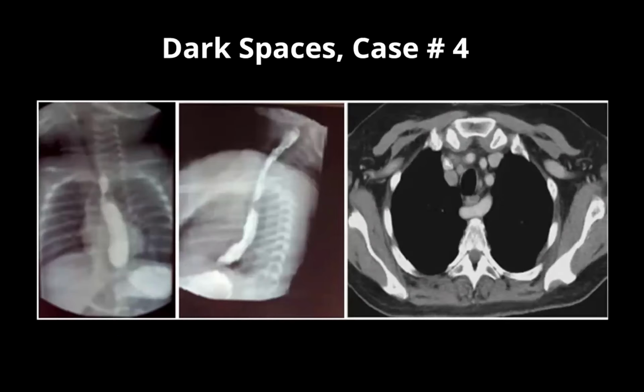This is just a companion case for the same pathology where on barium or upper GI study, it can cause that indentation on the esophagus, because the esophagus as well is anterior to that aberrant vessel, the right subclavian artery, and gives it this deformity, which is called the bayonet deformity, and the patients usually present with dysphagia.